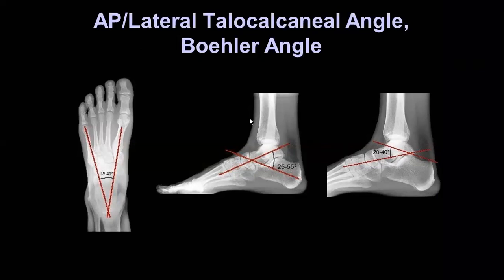Yes, the calcaneal fracture, to know the calcaneal fractures. When you find, yeah, normal it is between 20 and 40, and you should measure it like this. Sometimes when you see the calcaneus and you don't see any abnormality, or maybe a subtle abnormality inside, you should think about the Bohler angle and you measure it by your eyes.